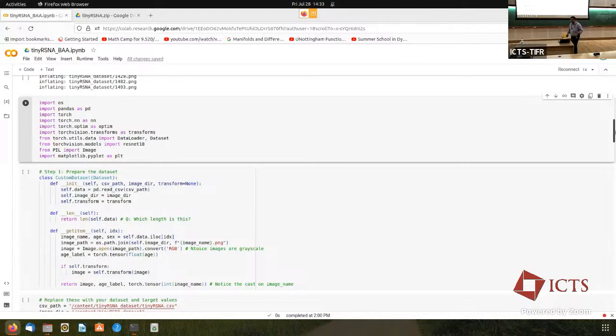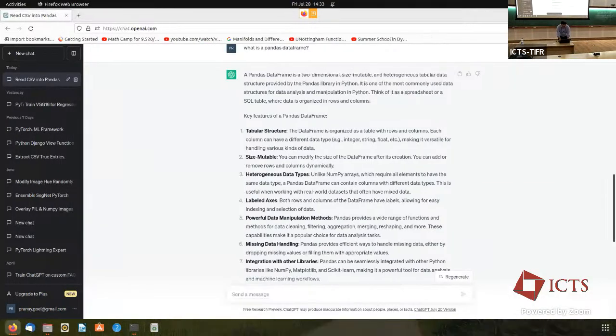Let me show you. Let me answer that in a different way. I'll prompt: you are a PyTorch developer, write a simple custom dataset class to load data.